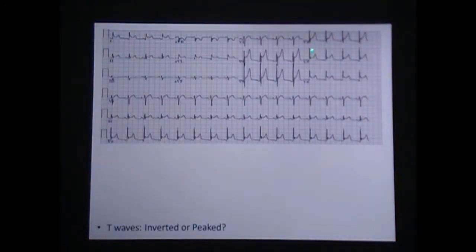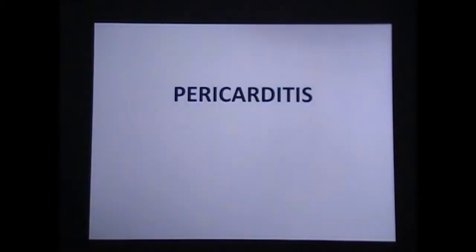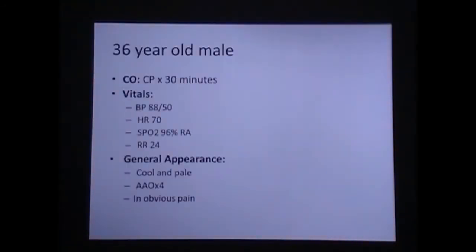There's a potential up there, and so yeah, I would say that they are slightly, but why is that? I put no, but now I look at it, I'd say possibly yes. Okay, so based on your assessment, you were able to go and see that most likely that's pericarditis. So one last one.